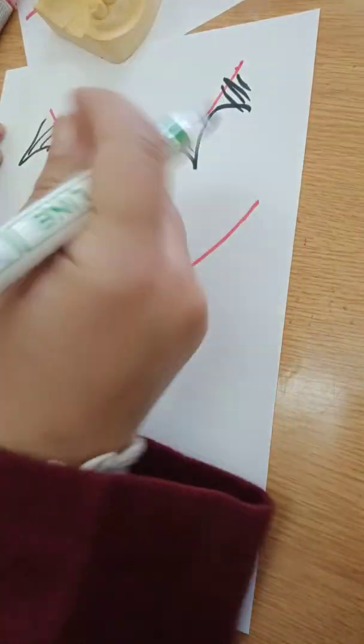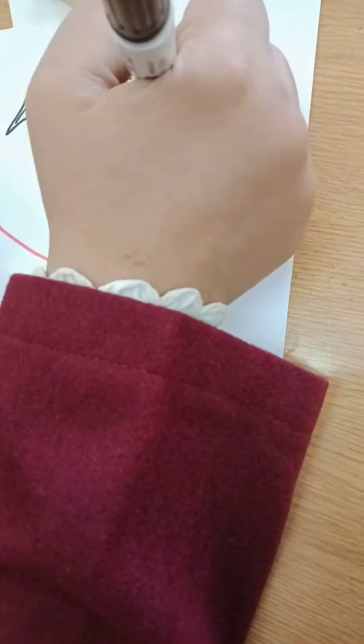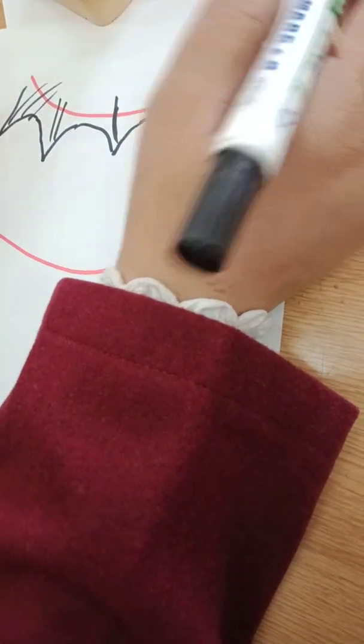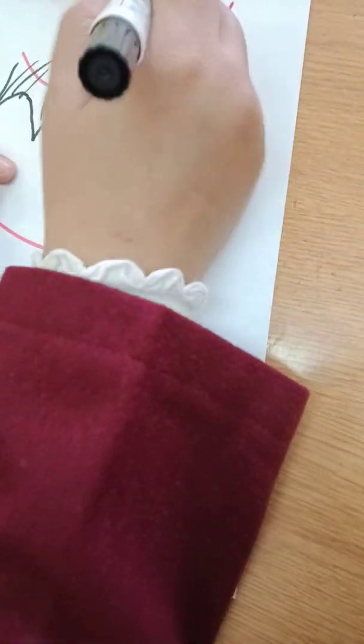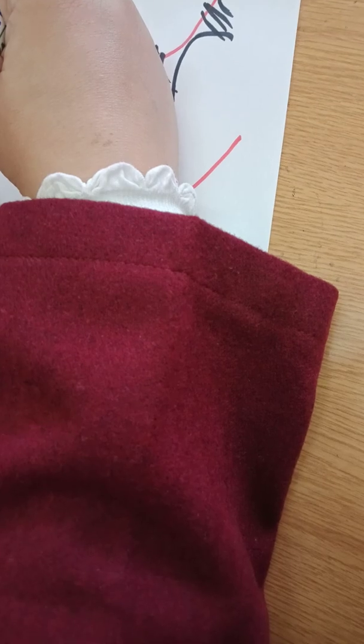Why do we need these slots? Because we want the escape of excess material. How do we cut these slots? By using a blade. And we finalize them by acrylic finishing burrs that trim off any rough material. This allows excess material to come out when we do our mock prep.